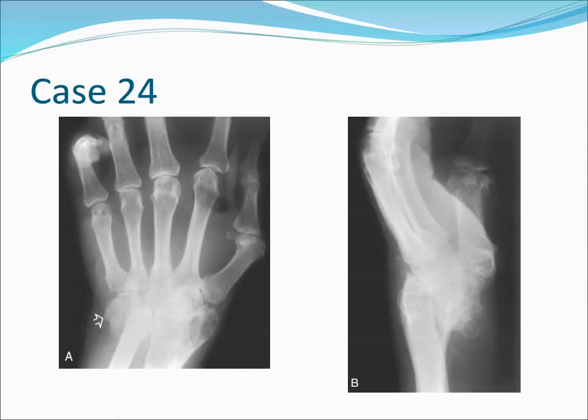This patient with CPPD shows severe joint destruction in the carpus primarily at the radiocarpal joint. A. Large subchondral cysts or geodes are noted. Heterotopic new bone or joint debris is also seen, arrow. B. Dislocation of the radiocarpal joint is seen, with the entire carpus lying volarly in relation to the radius. The findings of severe joint destruction, heterotopic new bone, and dislocation are classic for a Charcot's joint. This patient, however, had sensation in this joint. Therefore it is not a true Charcot's or neuropathic joint but a pseudo-Charcot's joint, which is occasionally seen in patients with CPPD.